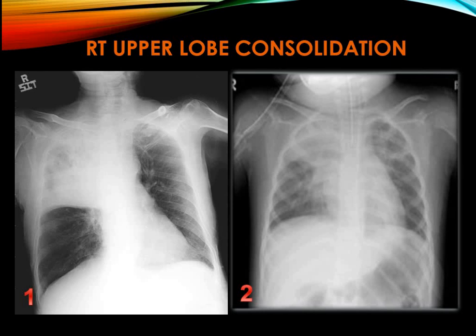سؤال, what is this sharp horizontal line which is present at the inferior border of the patchy opacification؟ الجواب هو horizontal fissure. لاحظوا أنه هذا fissure is extending from the hilum to the lateral chest wall, and this is the normal anatomical position of the horizontal fissure. It's neither elevated upward nor depressed downward. لأنه لو كان elevated معناها عندنا loss of volume. لو كان depressed معناها عندنا signs of increase of volume.